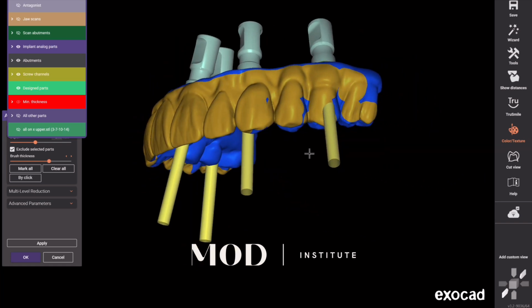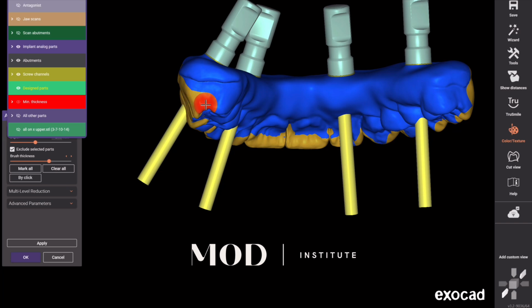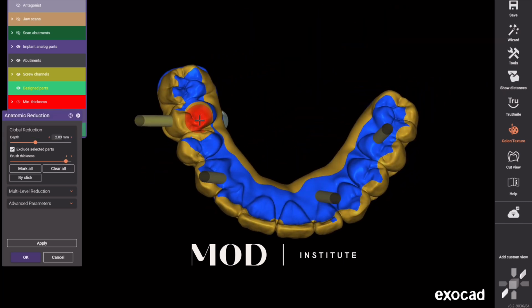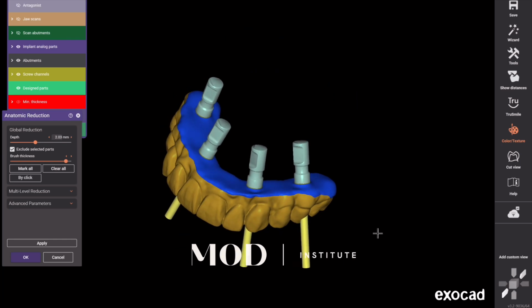Okay, so then on the lingual, what we're going to do is transition to a more thick bar like that, and a nice domed shaped structure here. Maybe like that. And then we eliminate the rest of the blue. Just like that. This is super easy, guys. I can't even tell you when I'm not going super slow. I don't know, it's a 10-15 minute design.